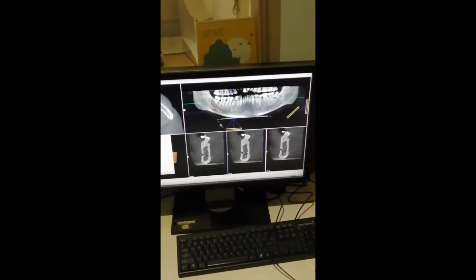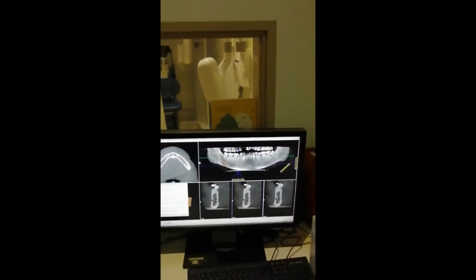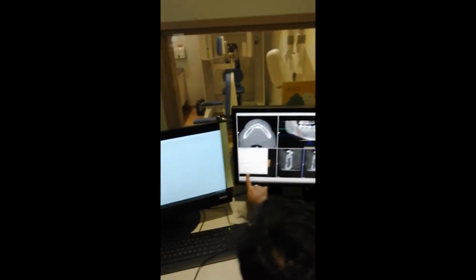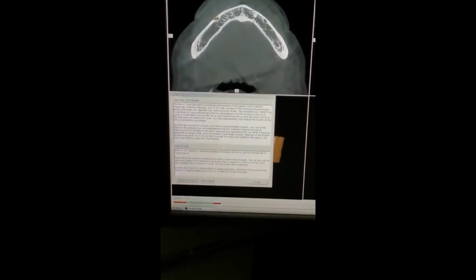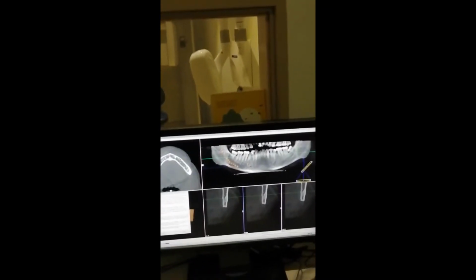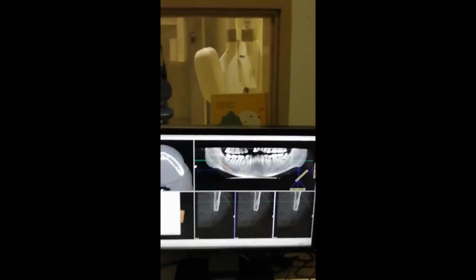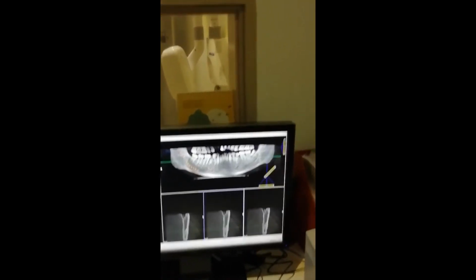Click. So after that, if I want only this side, then it is the right side. See, right side. Okay. So right canal, if I click, right canal comes. But let me also show you the other side where we can do it automatically. This we did manually. Because why? Because 11 points we have selected, right? Now I can just select the entry point and then the exit point and then tell the machine to do the estimation.